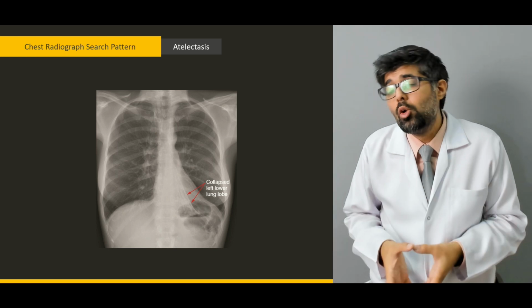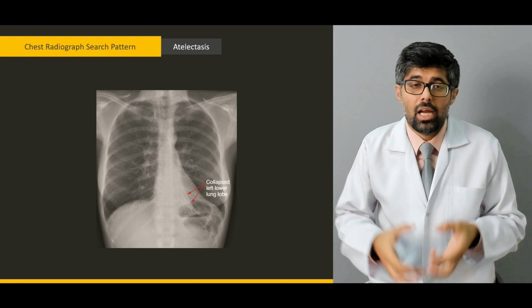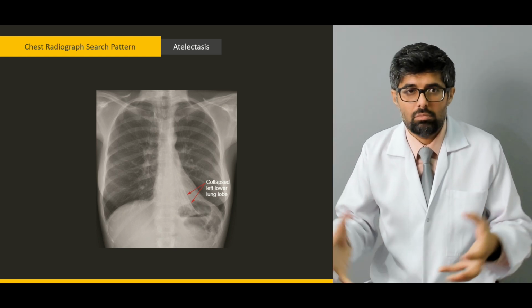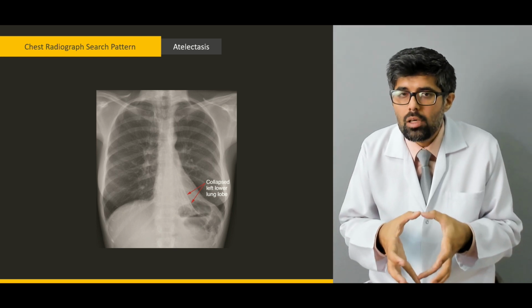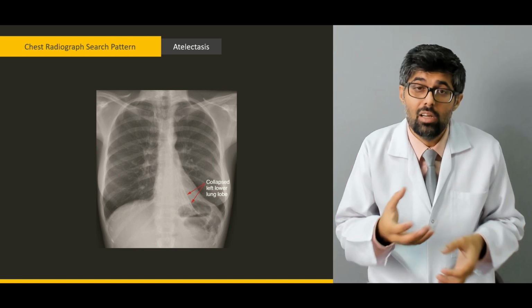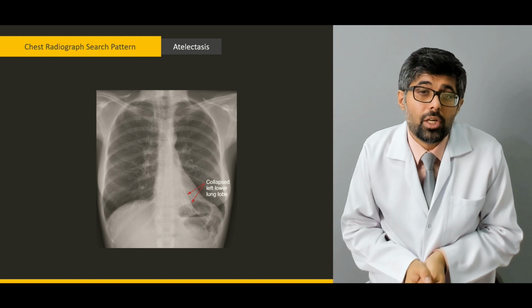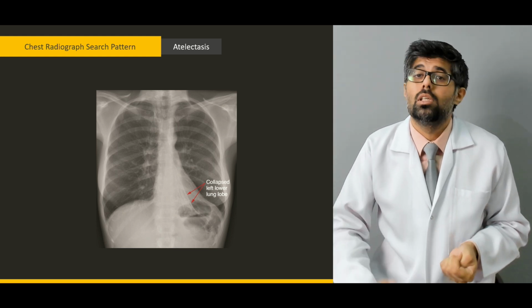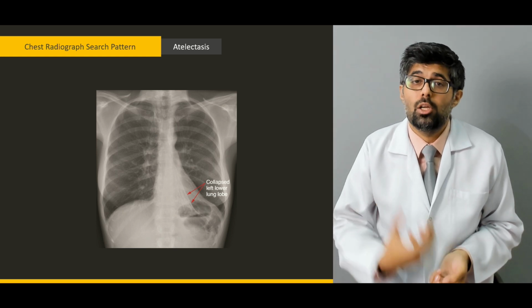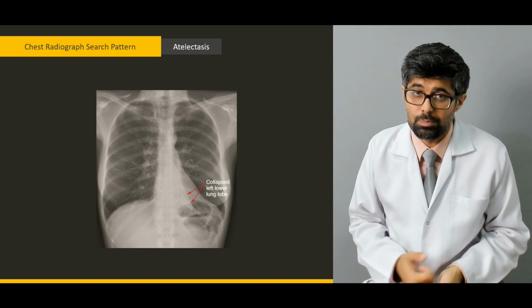When the whole lung collapses, it is usually referred to as pneumothorax, and it is usually presented on the X-ray by the shrunken volume of the lung but high density. Pneumothorax is again a very dangerous symptom, must be corrected on the spot, because of the pressure of the air on the collapsed lung, the patient cannot breathe. So it has to be corrected as early as possible.